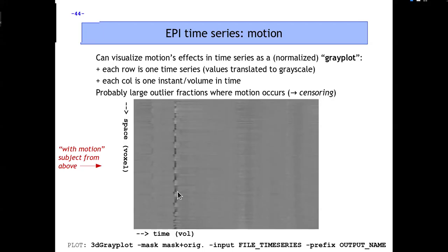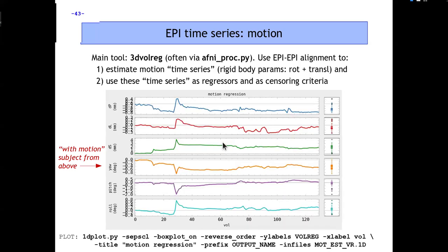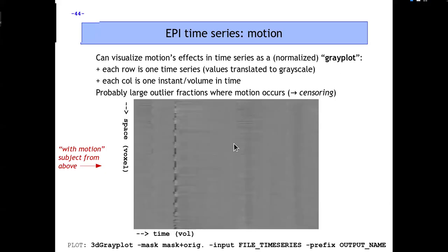Okay, so however you want to look at motion, these are ways you can all say, yes, the person was moving a lot here, the subject was not moving a lot out here. In the same way, the parameter might be non-zero here, but it's pretty constant. There's not a lot of motion here. The time series is fairly constant across here.